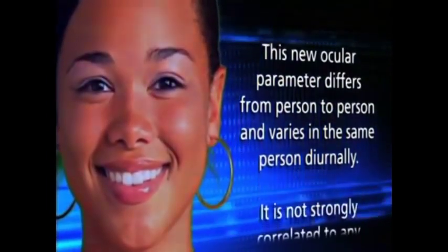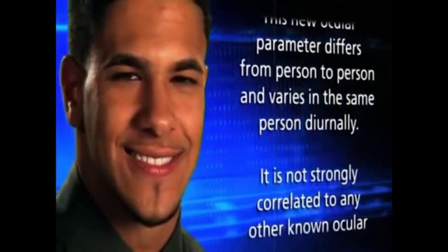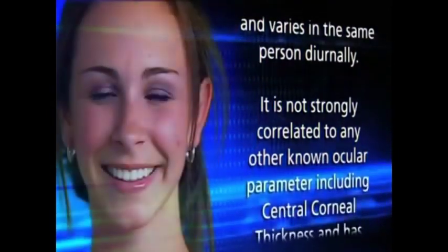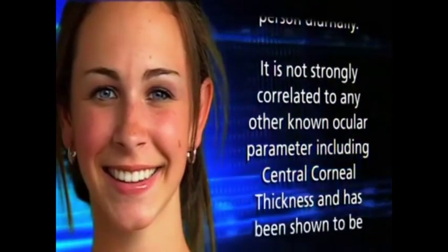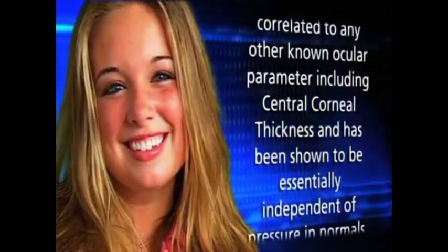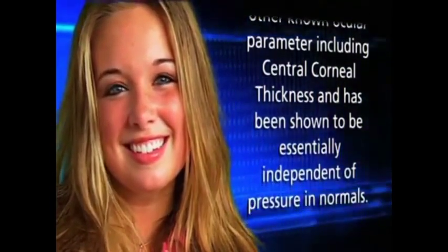This new ocular parameter differs from person to person and varies in the same person diurnally. It is not strongly correlated to any other known ocular parameter, including central corneal thickness, and has been shown to be essentially independent of pressure in normals.